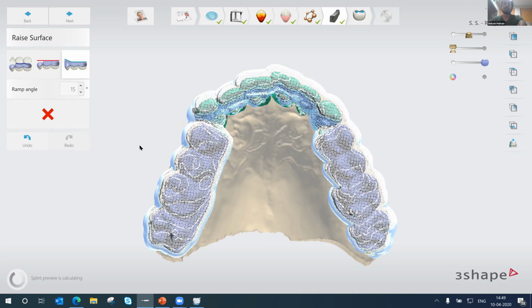Yes. So now you can see the anterior division I have in green color, and the posteriors I have in blue color. You can see these colors as well over here on top. So whatever you have chosen, simultaneously you can get those options here.